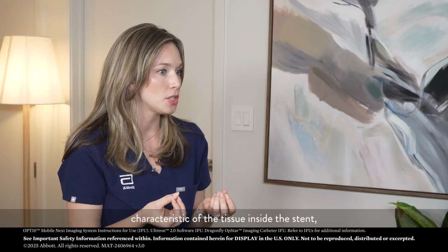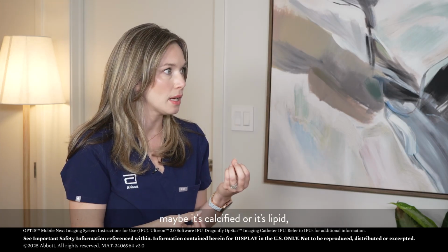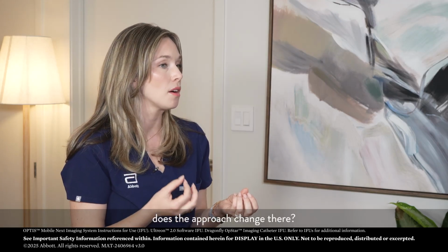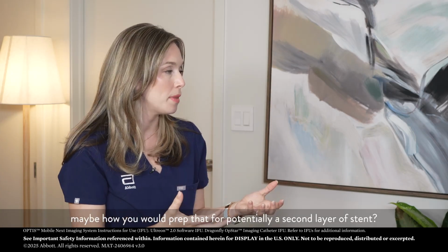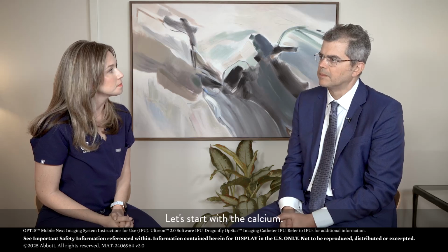If we're in a scenario where it's not fibrotic, the characteristic of the tissue inside the stent, maybe it's calcified or it's lipid, does the approach change there? Are there different algorithms or thought processes around how you would prep that for potentially a second layer of stent? Let's start with the calcium.